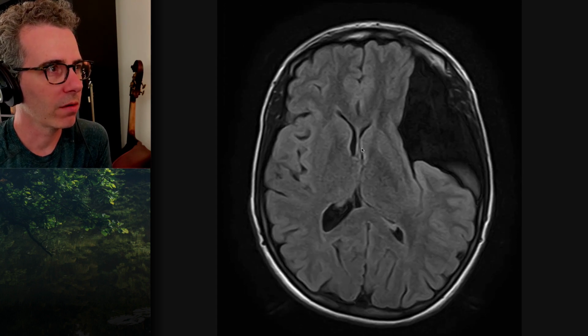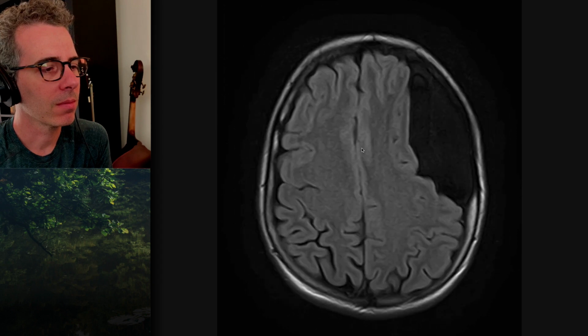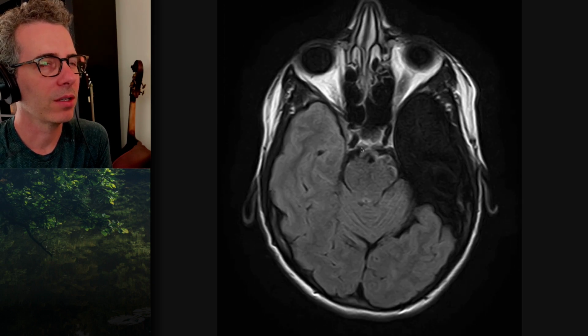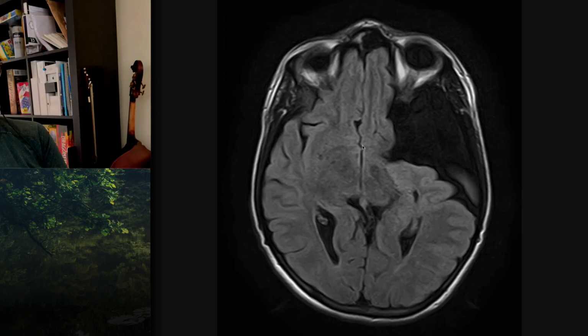Anyone read that there's only one foramen of Monro? I'd always thought there were two as well. Foramina of Monro, but that's without having read anything necessarily. It's just kind of what I assumed. Yeah, goes into two different places, right? So, yeah. Good. So that is an arachnoid cyst.